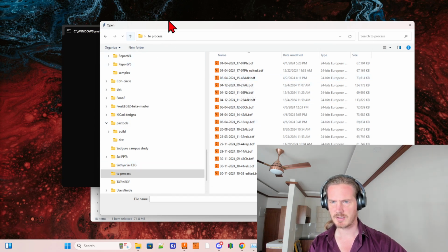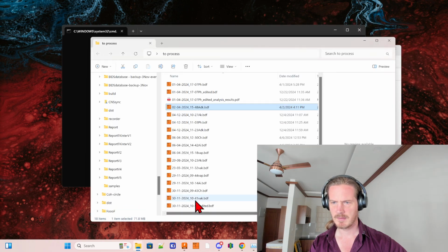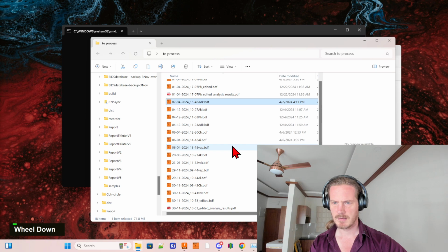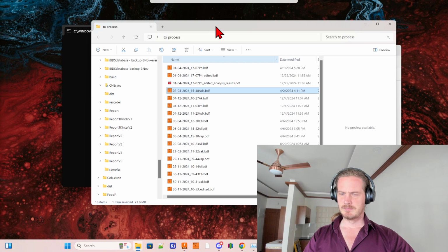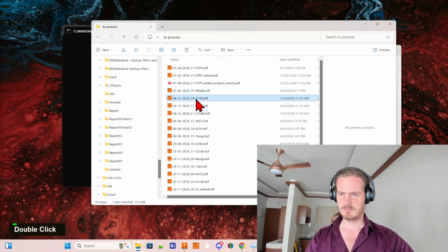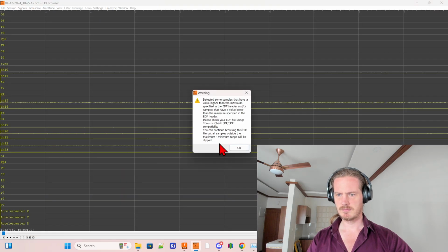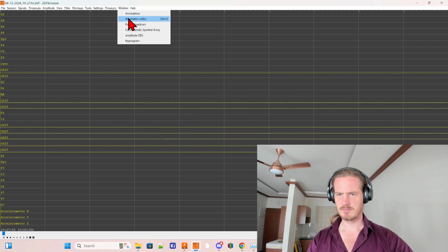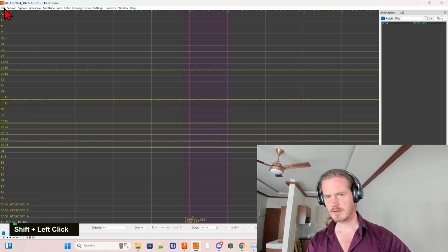It's supposed to be here. Okay, let's see, where does it save to?